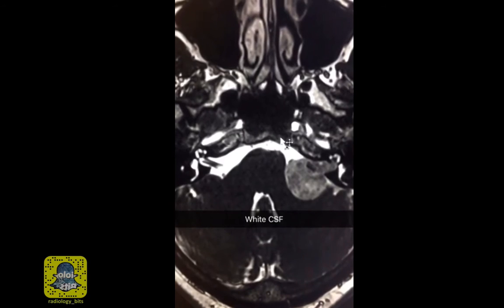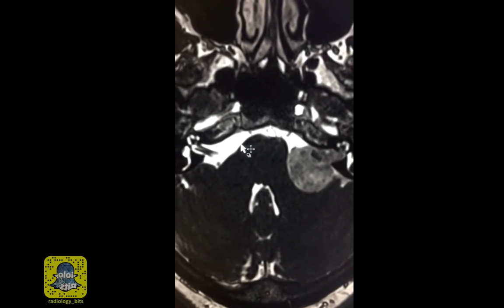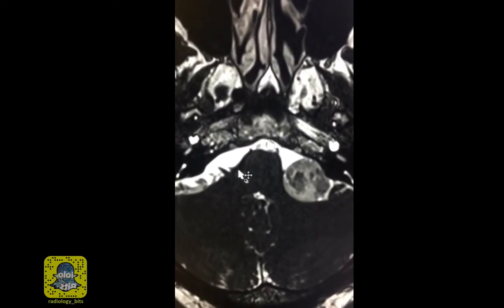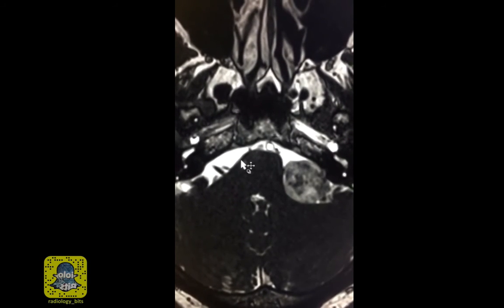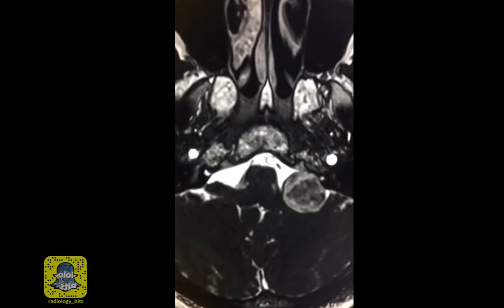First of all, this is a sequence from a brain MRI which is done in a very specific fashion. As you see, CSF is bright, so this is a T2 weighted image. You see that the brightness is extremely white, and this is a heavily weighted T2. And as you'll see as we go through the normal anatomy, the slice thickness is very small. With the thin slices, you could see more details. So this is a heavily weighted T2 thin slice acquisition, which is also famously called a Fiesta acquisition. For juniors, remember that these are thin slices in T2 that are good for anatomy.